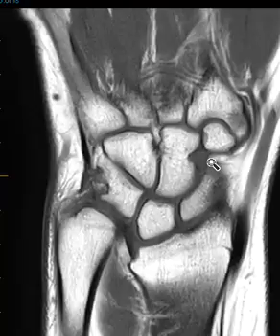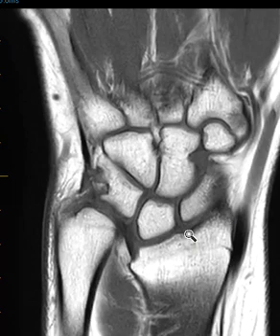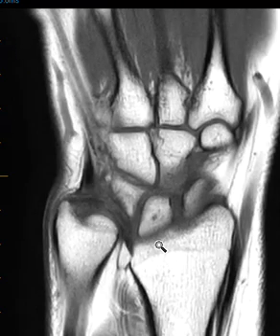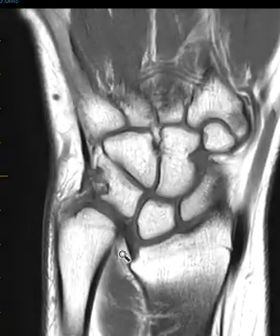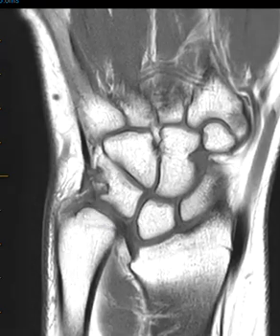So, on the MRI scan of the right wrist now, we see that the radius is abnormal. It's slanted downwards instead of being horizontal. The distal radial articular surface has ulnar tilt, and here's the distal ulna. The ulna is longer than the radius here, so we call that an ulnar positive variance. And with that abnormal configuration, we have narrowing between the ulna and the triquetral bone. The triquetral bone also has broadening of the articular surface here. It looks almost like a spur. There's just this developmental flattening and broadening and narrowing of this space.